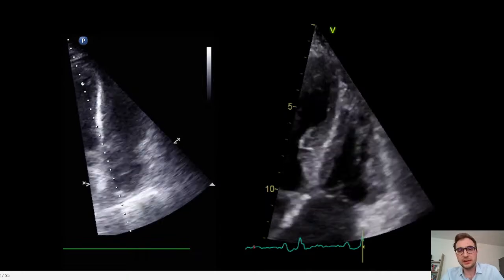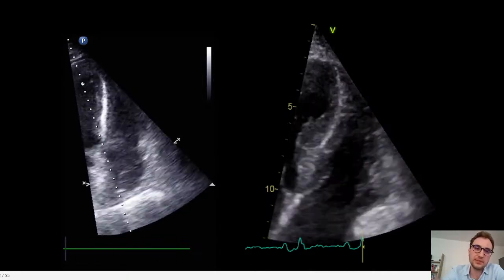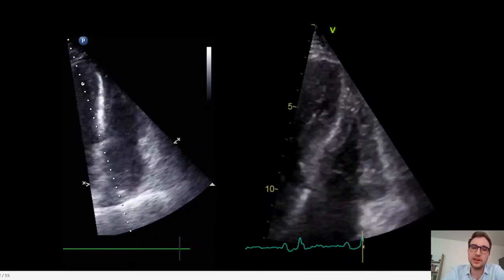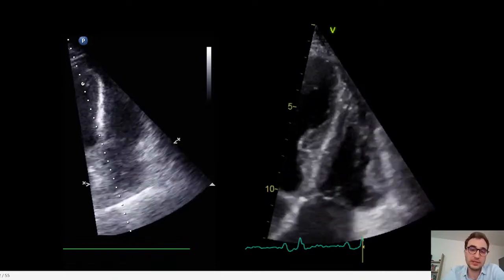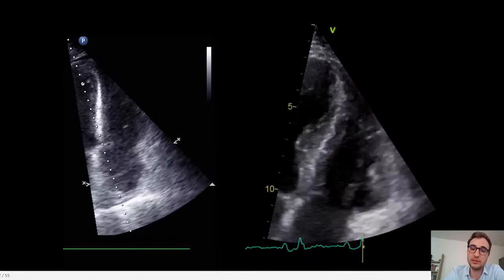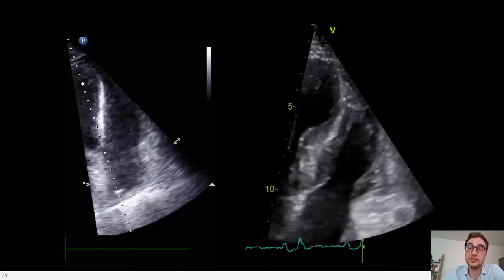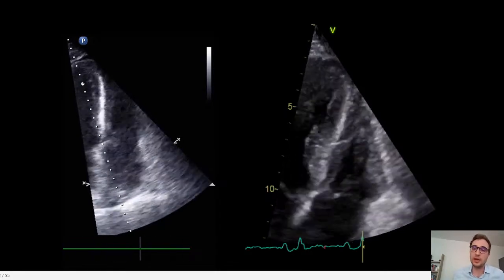So what do we see here on the left side? That's a patient with a definitely severe right ventricular failure with a severely depressed right ventricular ejection fraction. However, on the right side we have a patient with almost the same TAPSE value, doing completely well and has no symptoms. Actually, it's the same patient that I showed you a few slides ago.